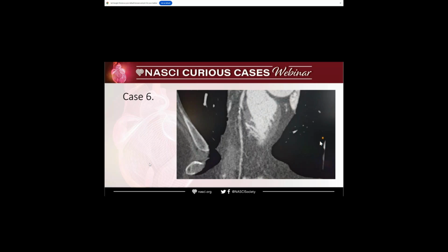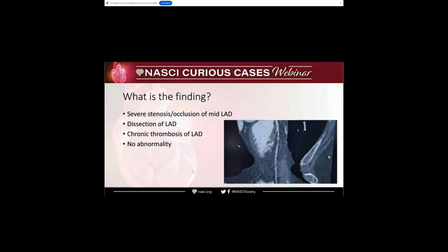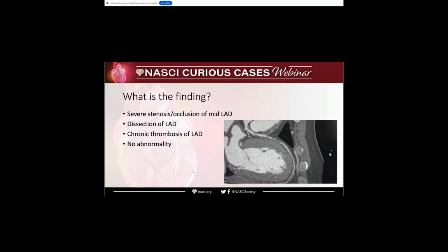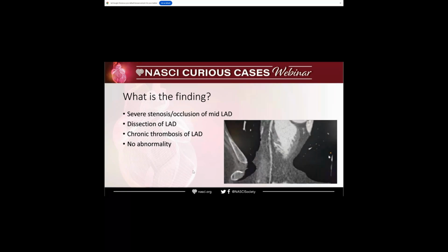And the question is, what is the finding, and what do you want to do? I'm showing the scan again. Yes.